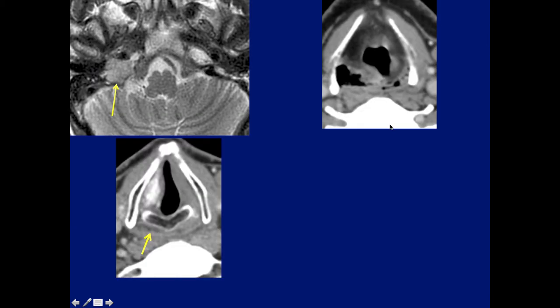Okay, what do we have here? Here's a glomus tumor in the jugular foramen. So we have now distal changes. We have the atrophy here. What is involved here? This, by the way, is silicone injection to enlarge the paralyzed vocal cord. But what is atrophic here?